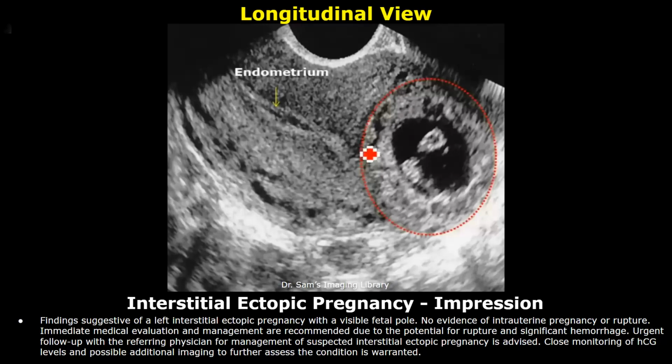Immediate medical evaluation and management are recommended due to the potential for rupture and significant hemorrhage. Urgent follow-up with the referring physician for management of suspected interstitial ectopic pregnancy is advised. Close monitoring of HCG levels and possible additional imaging to further assess the condition is warranted.